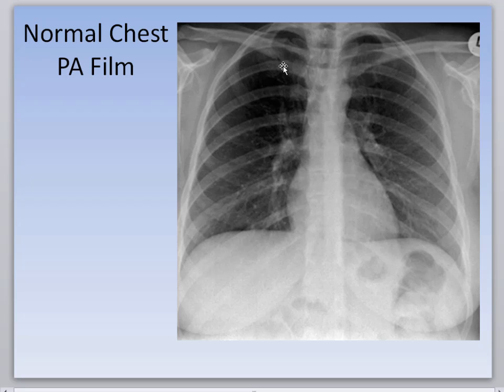This is actually the posterior ribs are the ones that you can see better. The anterior ribs you can see, like rib 1 here or rib 2, you can see it curling around underneath, and all of a sudden it kind of disappears. Why would it disappear here? Well, because it's costal cartilage here. It's not bone, so you don't see the anterior ribs. It is much harder to actually see.